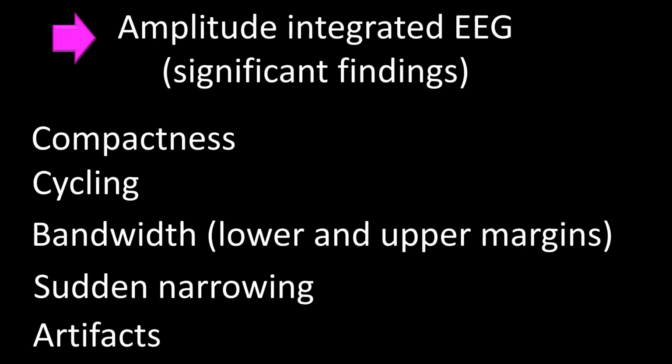The usual duration of an epoch for amplitude EEG clinical interpretation is 20 to 30 minutes long. The final reading, nevertheless, should incorporate the result of all epochs in the strip provided for interpretation. In this talk, the final reading will be emphasized.